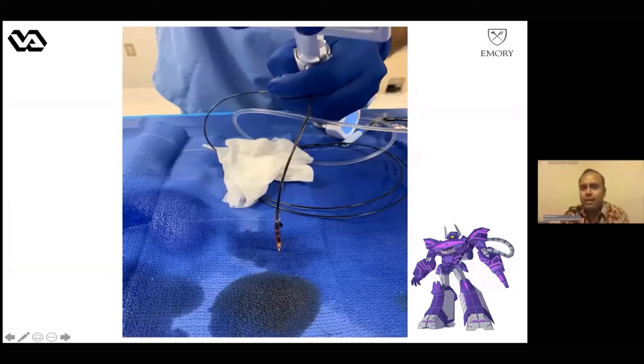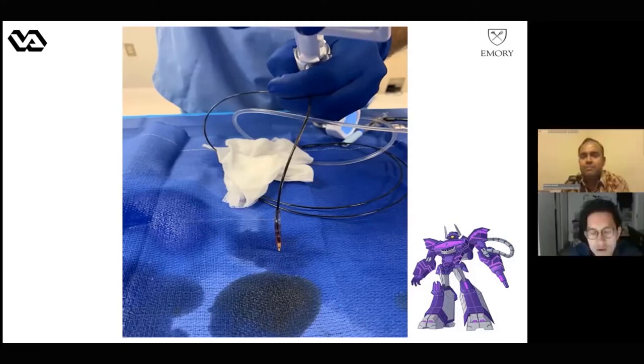Now, I know in Asia you've had more experience with Shockwave. Very quickly, how often do you see balloon rupture with the coronary Shockwave in Asia? I don't know. I don't have experience in Indonesia. I don't know whether Hong Kong maybe. Vincent? Yes, we do encounter some perforation or rupture of the Shockwave balloon, but mostly it's after several shocks. So the initial 4 to 5 runs are okay, but at 6 to 8 runs, after repeated inflation, it is more prone to rupture.